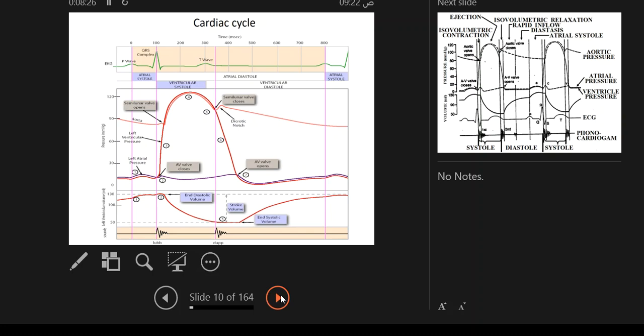That's why we do not do hemodynamics except if there is an electrocardiogram, supposedly. We don't see that all the time, but it should be there, because this is how you time your opening, the ventricular pressure, what occurs, as you can see in the systole. The systole occurs from the beginning of the QRS to the end of the T wave. Although the T wave is a diastolic event, the mechanical systole is from the QRS to the end of the T wave. And then diastole goes on, and then atrial contraction, as you know.